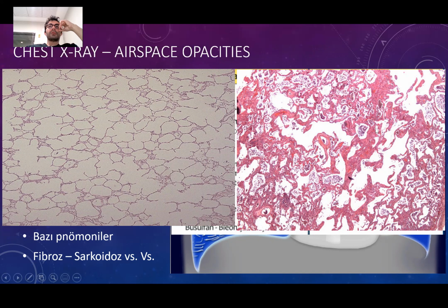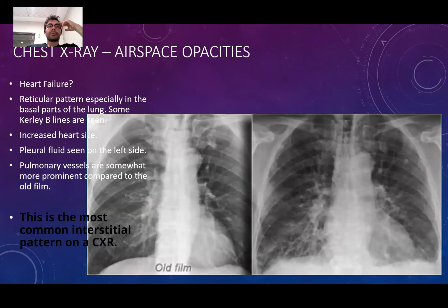In case of edema, the supporting tissue of the lung is going to be increased. So we will start to see lines, interstitial appearance, reticular appearances. This also happens in cases of heart failure, as I have told. So apart from seeing consolidations, when we are seeing linear densities, we should always consider heart failure as well. Not because it is very typical, but because it is very common.